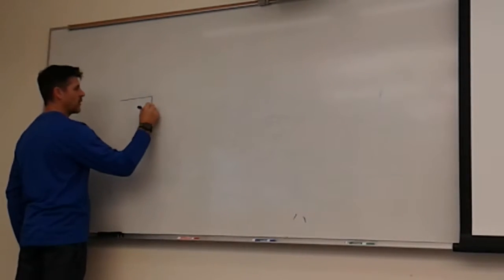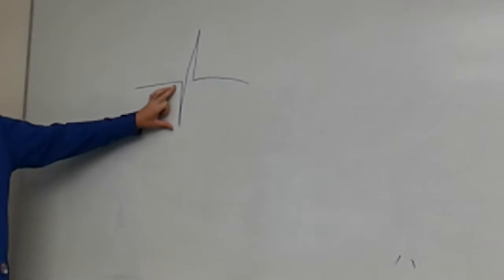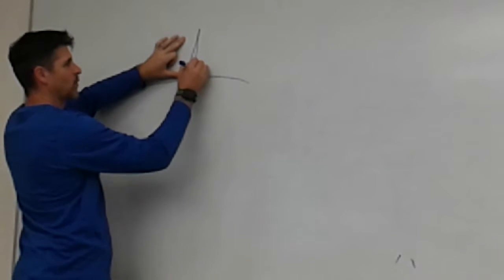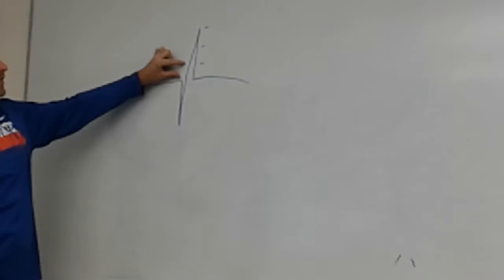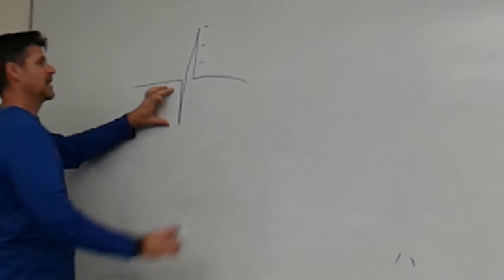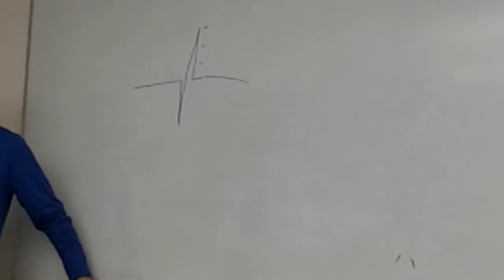If we measure in millimeters, and our Q wave is greater than or equal to a third of the height of the R wave. So if we're working in thirds, there's the height of it, there's one third the height of the R wave. If this Q wave is greater than that height, if it goes deeper than the R wave goes up in this direction, then that's also a pathologic Q wave.